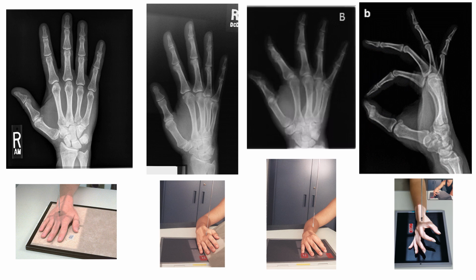Hello, this video is for radiologic technology students to learn the radiographic criteria of hand x-rays. So I have a PA hand here next to two obliques, the two different positionings of the oblique hand x-ray, and a lateral x-ray. And this would be our routine exam. We would only be doing one of these obliques.